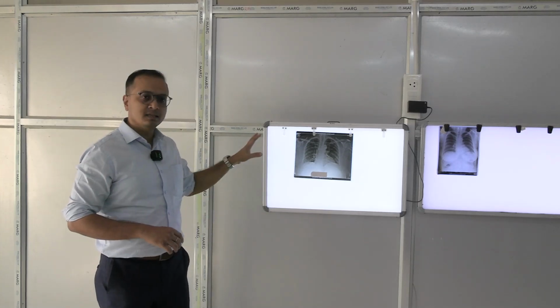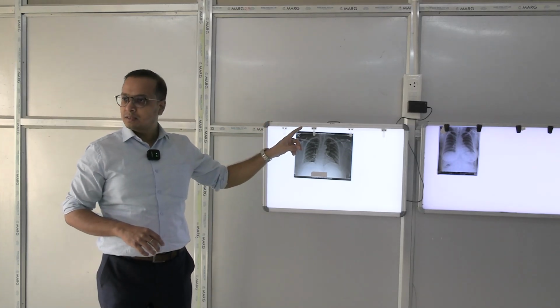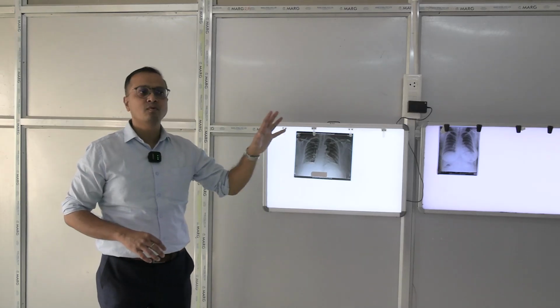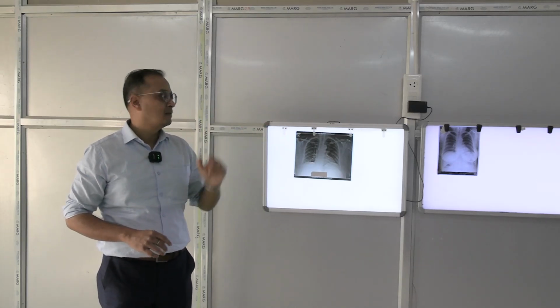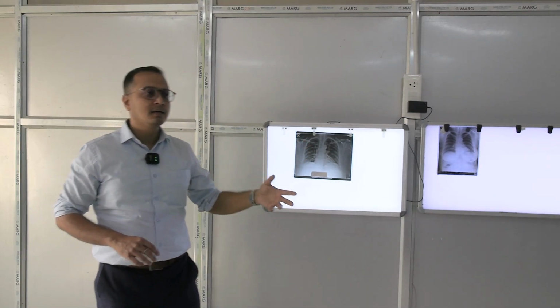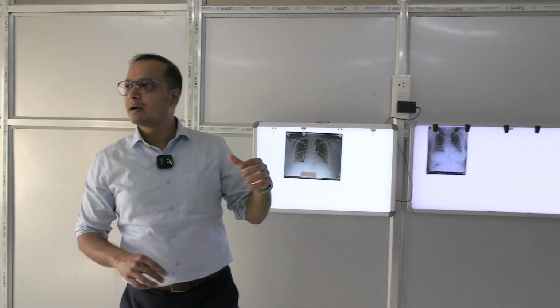So, whenever you are given an X-ray plate, the number one thing you have to figure out is whether it is a general plate or a special one. This is the first thing you have to ask yourself whenever you are seeing it: is it a plain X-ray or a special X-ray? Once you see that, then you have to look at how this particular picture was taken.